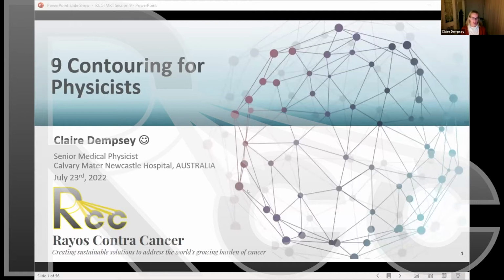So what I'll do today is walk you through some of the different contouring things that, as physicists, we need to think about when we're planning IMRT and VMAT plans, and we'll take it from there. So I'll get started.